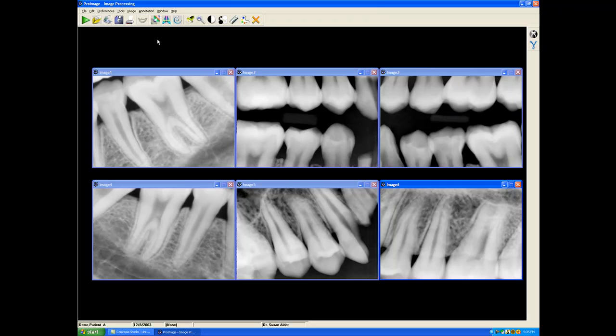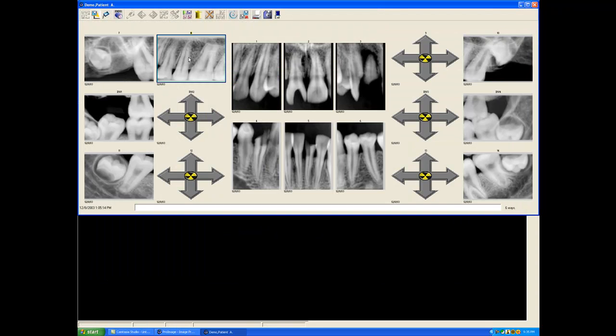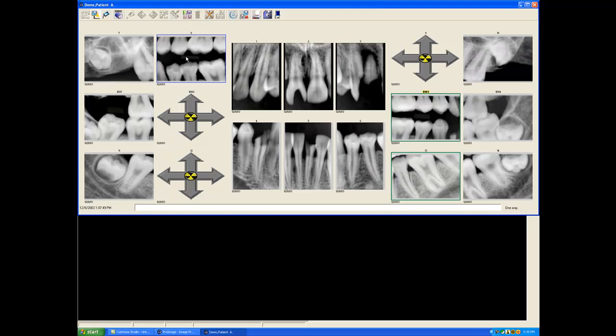So this is a way that you can bring the client over on the side and say, here's the sequence that we did for a root canal, or for whatever other reason you may want to have all of the radiographs put on one particular position associated with a given patient to be shown all at one time. So this is a very powerful feature. If I close all of these, I can then drag and drop these images. I want to make sure I'm at the top of the stack here. Back to their corresponding positions.